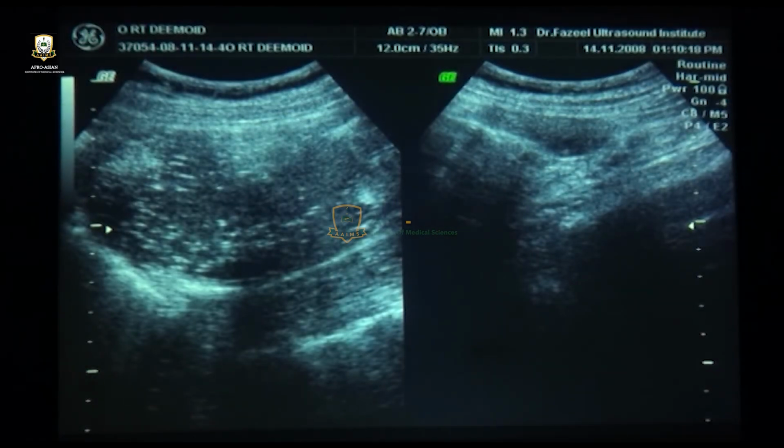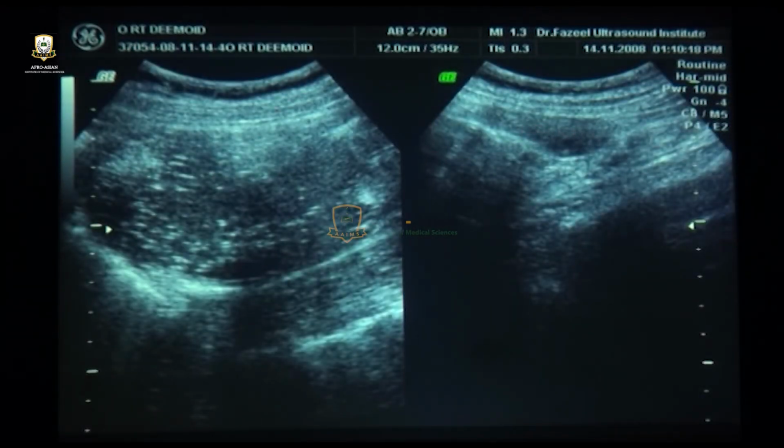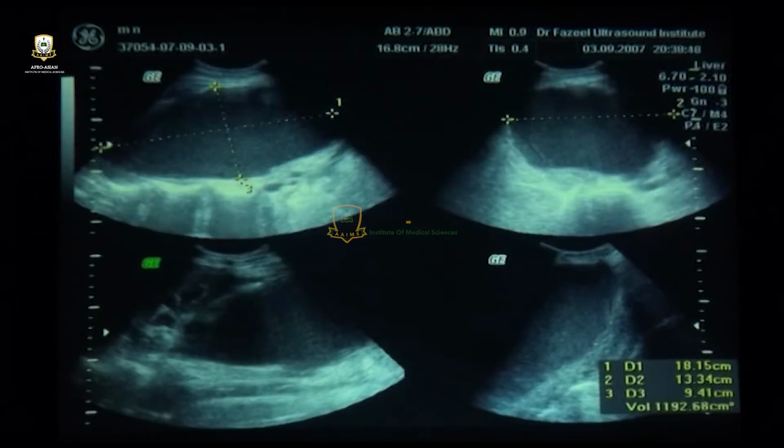One ovary is normal. This one is normal. This is dermoid. One appearance of dermoid. But sometimes a pelvic abscess will look like this one. So presentation is important. Patient will have high-grade fever and pain. This patient had ovulation induction for infertility, and this is ovarian hyperstimulation syndrome.